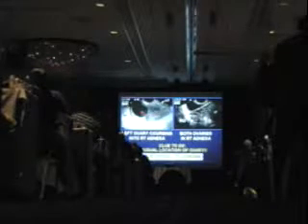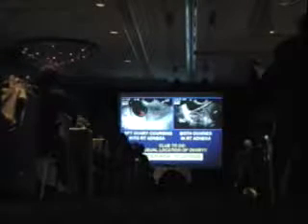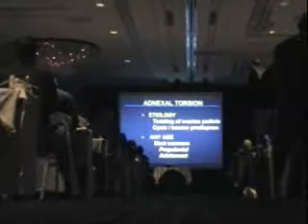So in these cases, the torsion caused the ovary to go deep in the cul-de-sac and even to the opposite side. Interestingly, in both of these people, their symptoms are where the twist occurs in the tube, not so much where the ovary ends up, but at the site where the torsion actually occurs. So we know about torsion here. I emphasize it can occur in young women.